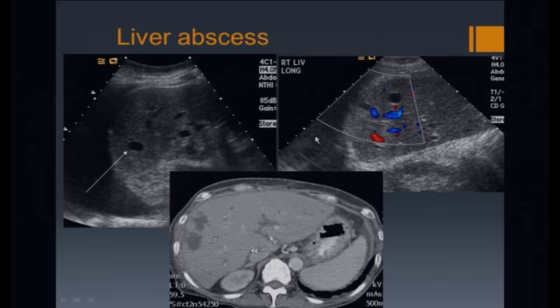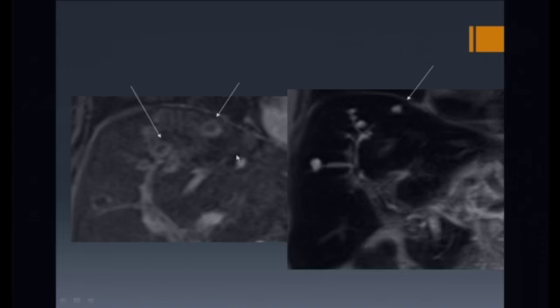And this is the equivalent CT of a patient with this liver abscess. Here you can see large fluid collections rapidly appearing in the liver that grow. And this is a corresponding MRI in someone with multiple liver abscesses. Here on this MRCP image, we see high signal fluid collections that are budding off the biliary tree. And this patient had hepatic artery stenosis, with resulting biliary necrosis and development of little abscesses that are communicating with the biliary tree.